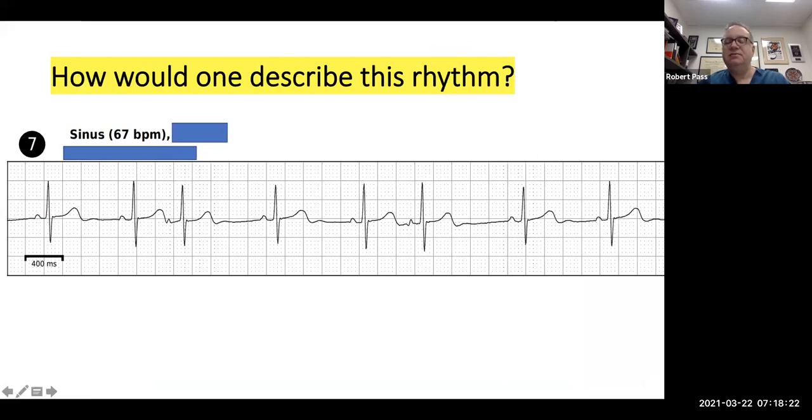Let's see if Dr. Ahluwalia, you are reading this Holter or Zio, and this is the tracing that you see. How would you describe this? You have to interpret it. You are working in a very remote area where there is not an electrophysiologist to interpret this, so you must interpret it. So how would you describe this in your report?